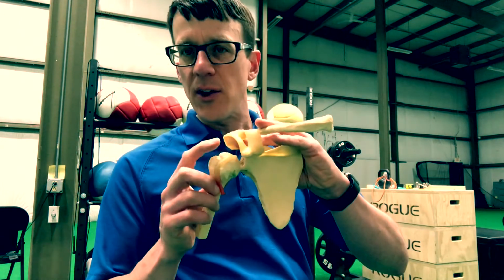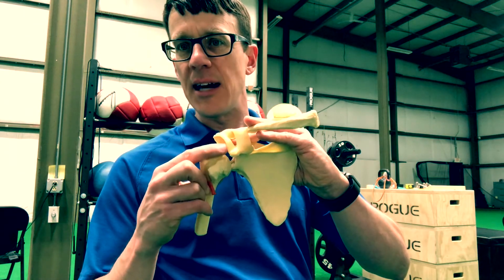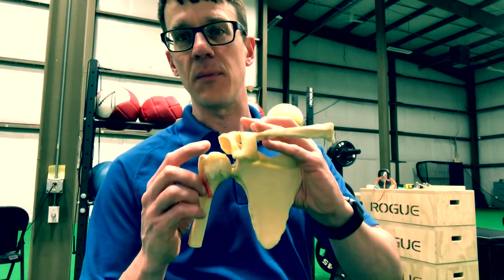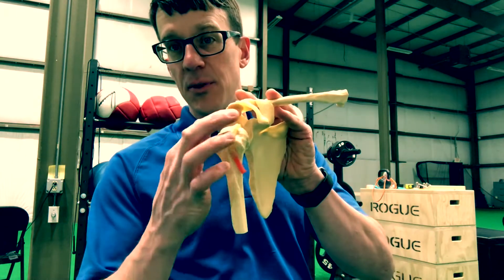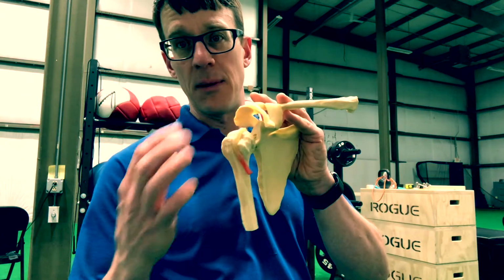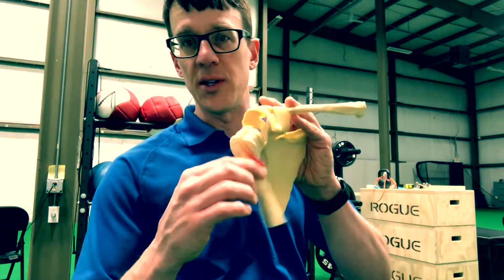They'll talk about rotator cuff involvement on your MRI and tearing in this area. That's basically the tendon of your rotator cuff muscles. They'll also talk about the bursitis. That means fluid buildup in the sacs underneath there that are meant to prevent friction in the shoulder when we're doing so much work with it.